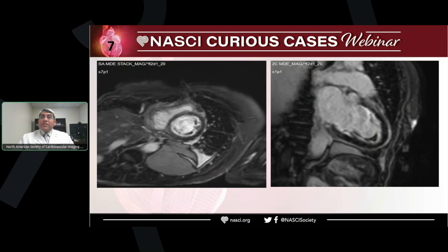So you can see this in patient with amyloidosis, but you will see more myocardial thickening. You can see it in patient with systemic sclerosis sometimes. And in those cases, like this case, patient with eosinophilic endocarditis or Loeffler's endocarditis.